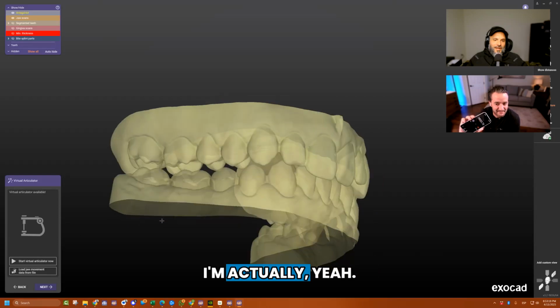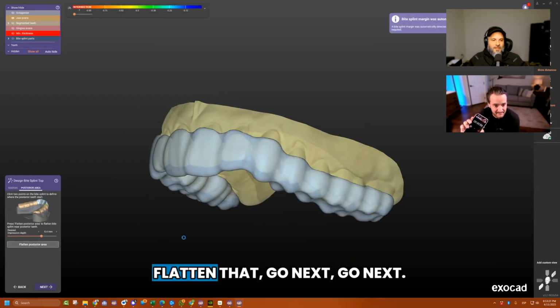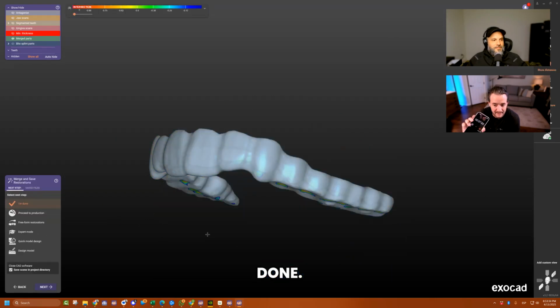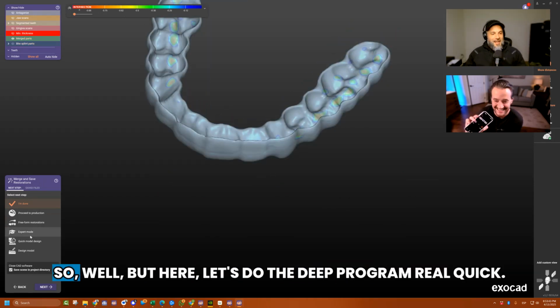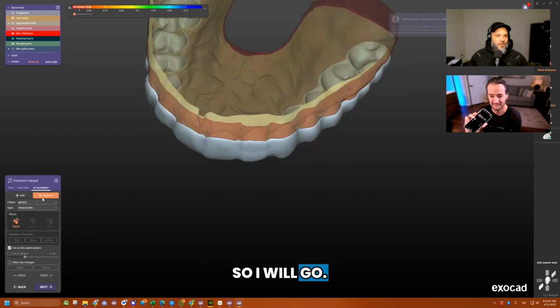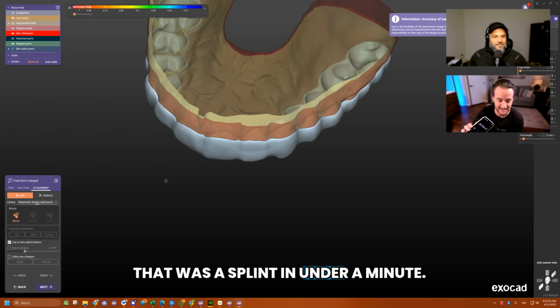So I actually take the time to do the posterior area, flatten that, go next, done. Stop it. That's 35 seconds. Stop. You're not done. What about the deprogrammer? Well, I mean, you said splint. But here, let's do the deprogrammer real quick. So keep it going. All right, so that was a splint in under a minute.